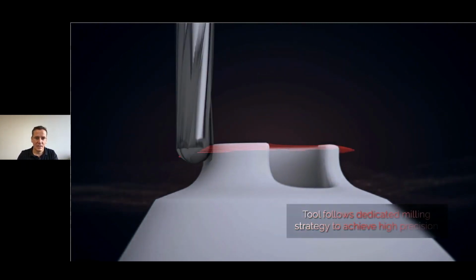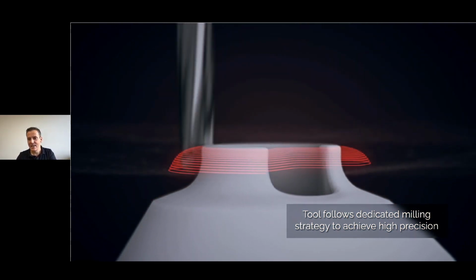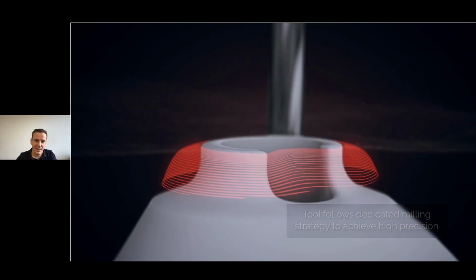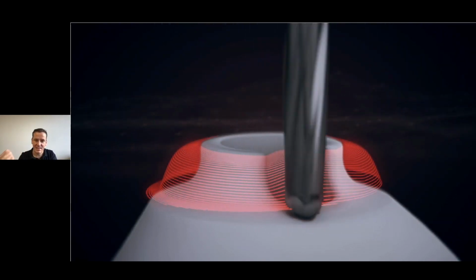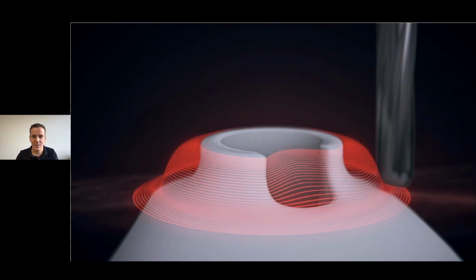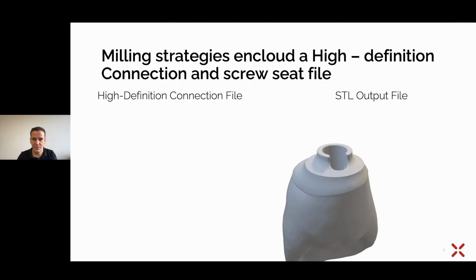Here you can see in this video how this is working. The tool is following the dedicated milling strategy to achieve high precision. You see the tool is following exactly and accurately this given milling strategy, and that's why, in combination with this Matrix design which we designed for CAD/CAM technologies, it's possible to have this absolutely perfect fit.